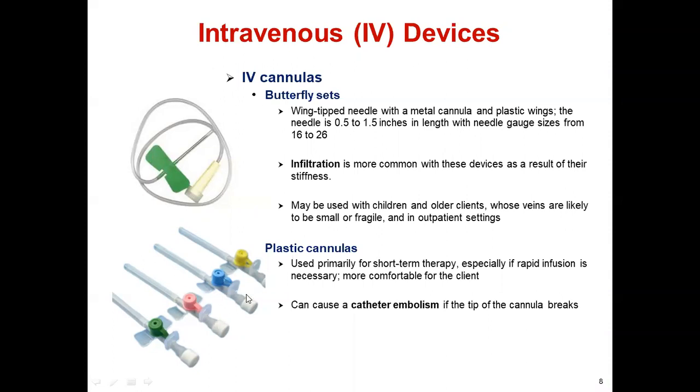In this picture, you can see plastic cannulas. They have different sizes, different lengths, and different calibers. They are used primarily for short-term therapy, especially if rapid infusion is necessary or if it is more comfortable for the client.